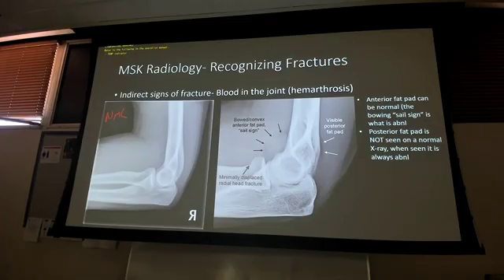Look at your densities, okay? Look on your screen. It might be hard to see it on this screen, but there is an area of radiolucency right there. Soft tissue is one color, and you get a dark area sitting right here. That's an anterior fat pad. That's normal. That's supposed to be there. Hang on. When I go to the black arrows and I go to the abnormal, that radiolucency looks more like this.